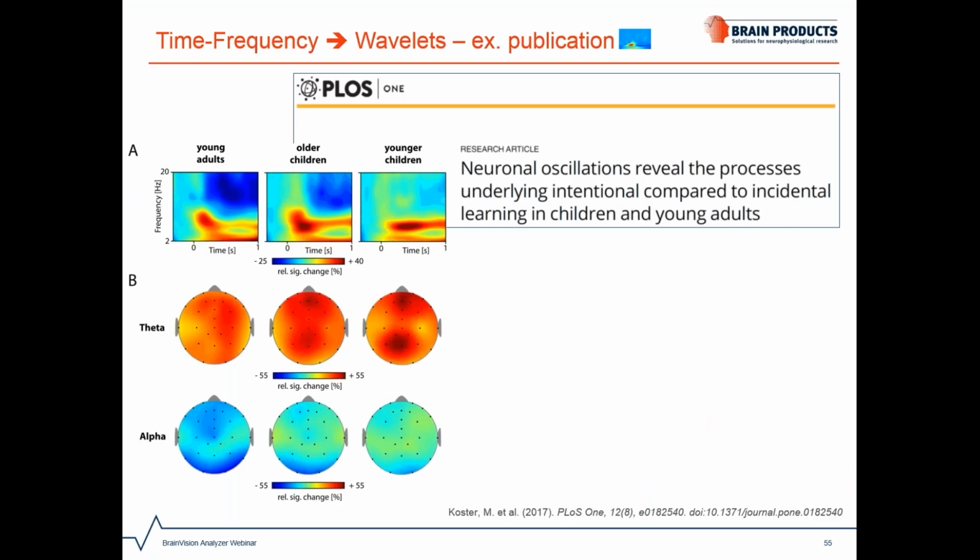In this publication, the authors used Analyzer to show both the time frequency plot of the 3 age groups and the topographic maps for different frequencies in a learning task. The time frequency plot shows the result as presented in Analyzer just now as both evoked and induced activity.